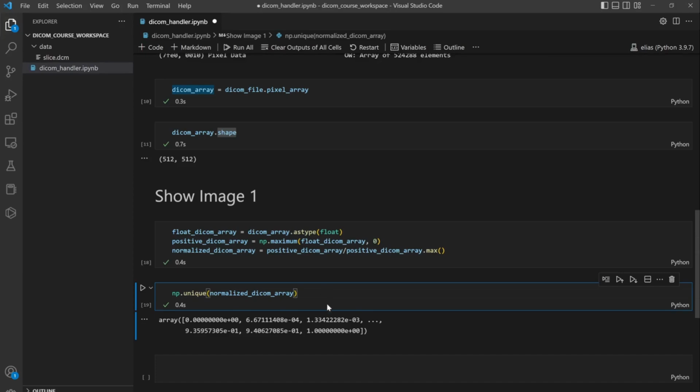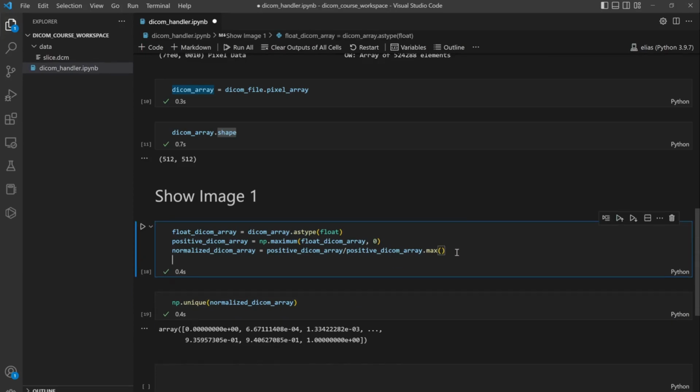There is another one, but this is one step. To do that, we just need to multiply it by 255. Since the biggest value is 1, the biggest value will be 255, the most white pixel, and the smallest value will be 0, because we multiply 0 by 255, which is 0, so it is always black.